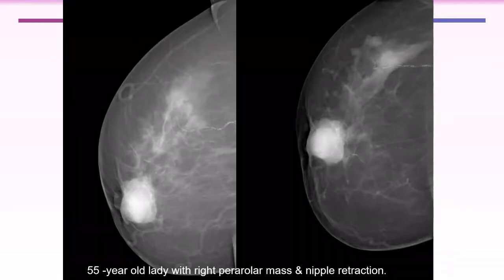There is vascular calcification in the lateral part of the breast. It might be due to diabetes or atherosclerotic changes. No abnormal lymph nodes. Can you exclude lymph nodes in this image? No, the axilla is not shown. Okay. So what about the rest? Is it a single mass?